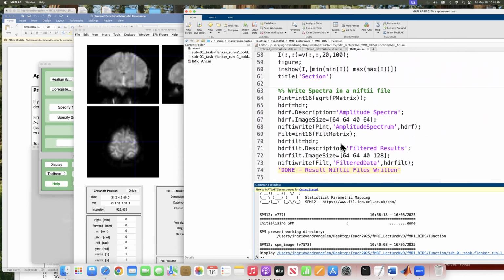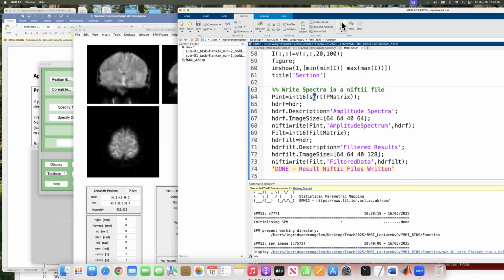And then, which is really powerful, I think, because now you can really interact with your SPM package, you can take your processed data and save that as a Nifti file. And that Nifti file can then be read again by the SPM package. So that's what I see as a huge advantage for people that are already used to Matlab, have Matlab available, and want to do their proprietary stuff with it. So now let's run this program and see what it is doing.